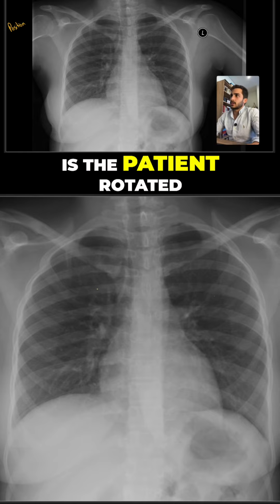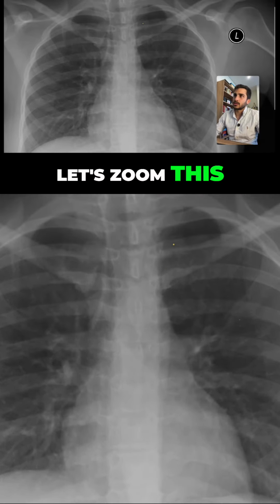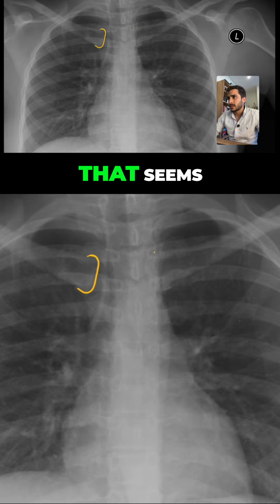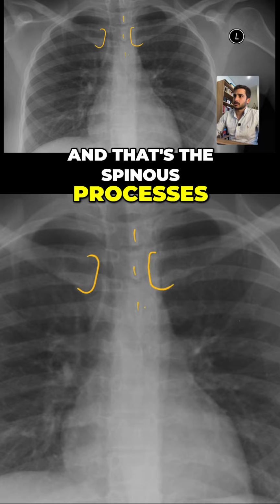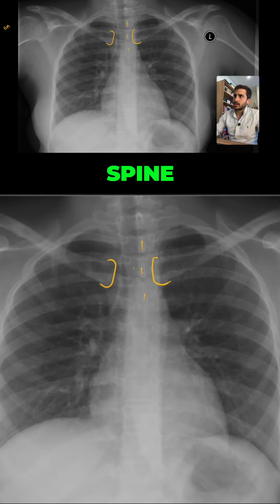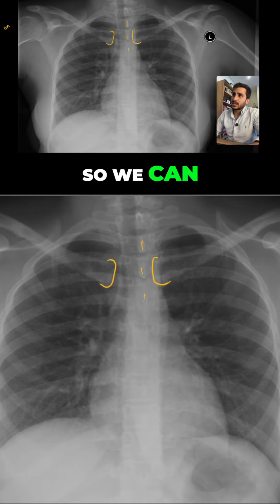Now, is the patient rotated? Well, again, if you look at the medial borders of the clavicle, let's zoom this in a bit. So that's the medial border of the right one. That seems to be the medial border of the left one, and that's the spinous processes. Okay, if you look at the overall position of the thoracic spine, there doesn't seem to be much scoliosis. It's relatively straight, so we can kind of conclude.